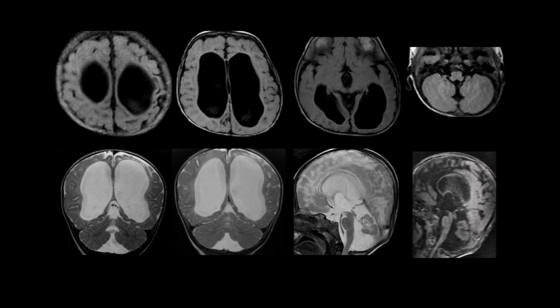This vermis change, is it secondary to fourth ventricular dilatation, or how do we explain that? You mean the flattening of the vermis? Vermis signal change. There is some hyperintensity in the coronals.